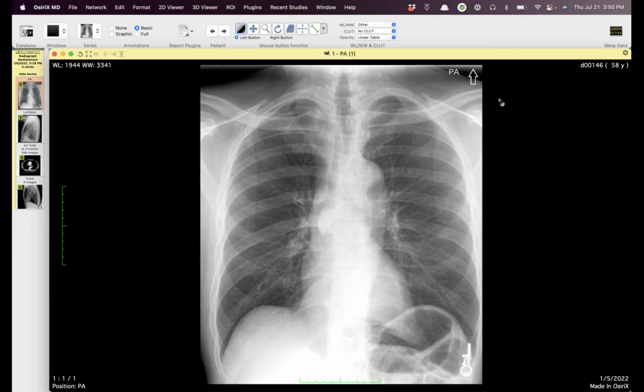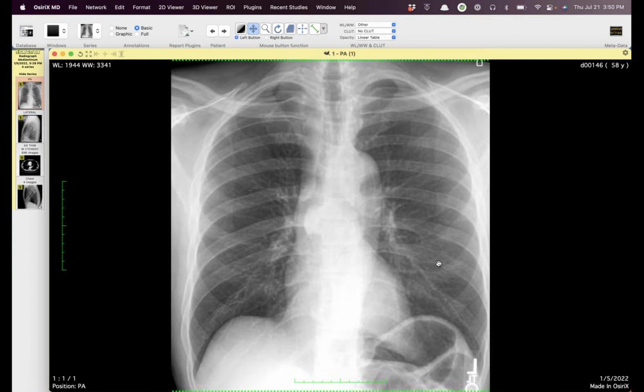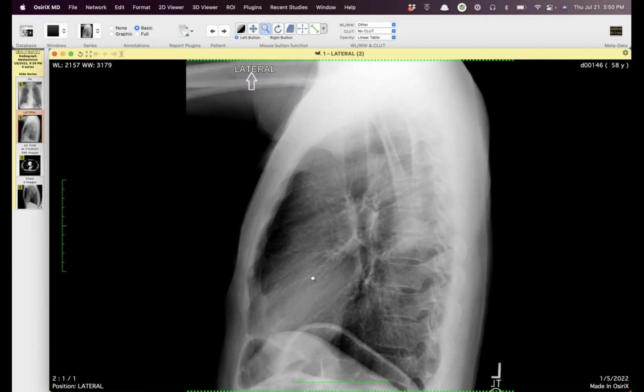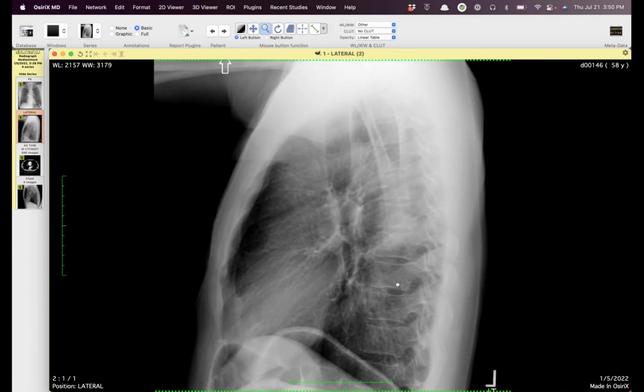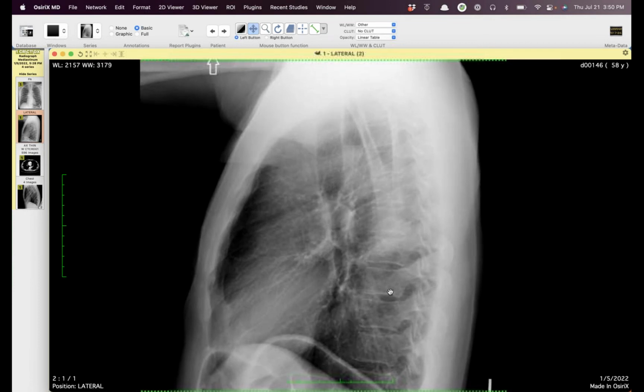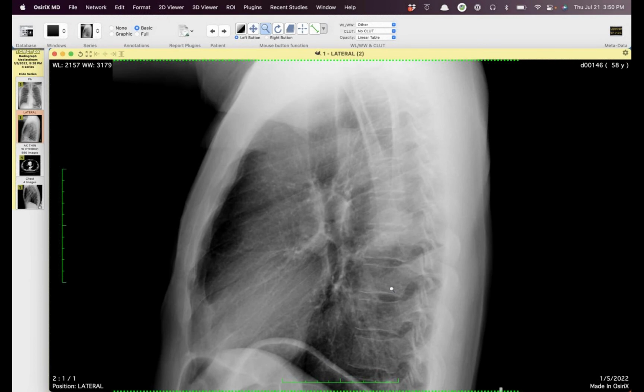This is an interesting radiograph, and this one gets filed under the better lucky than good collection that I have now. If you're looking at the PA view, I think the first thing that jumps out is this, and that was what jumped out to the person. This was from an outside hospital. So certainly really dense, looks like bone, and sure enough, looks like a big osteophyte here. And they had said, question mass, recommended a CT. Does anybody see anything else on the lateral view here that bothers them a little? Because it's super subtle, and I don't think I would have called it prospectively.